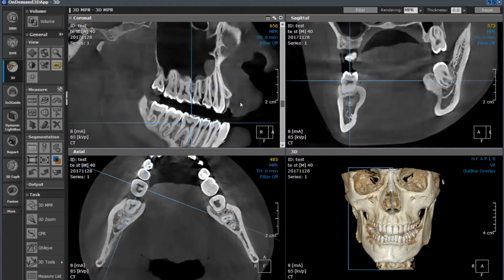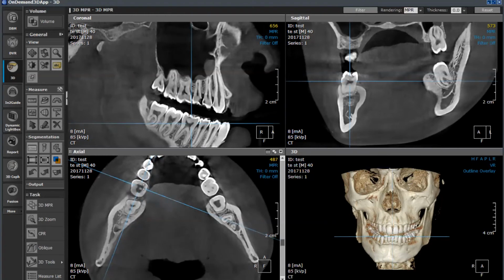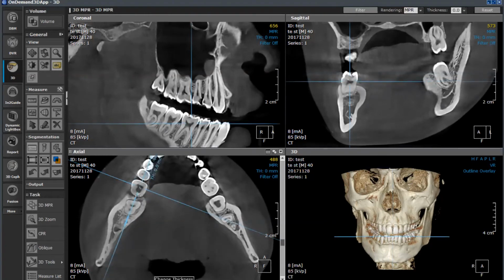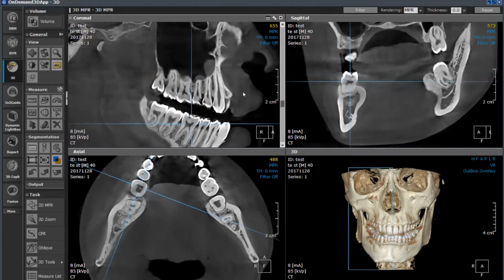But it just depends on if you have calcifications or other obstructions inside there. This kind of looks like it has something in the middle of it as it comes up top here, but it may just be an infolding. But it looks like the canal itself is pretty open to do something like a CPR function.